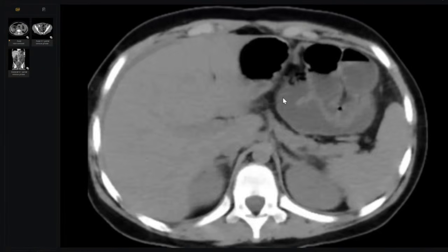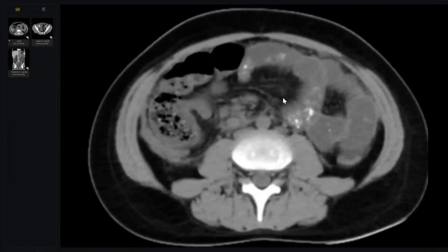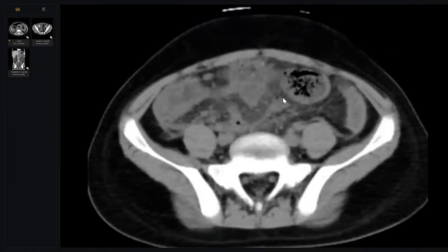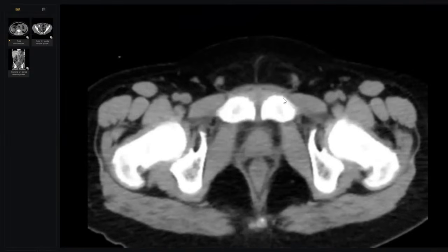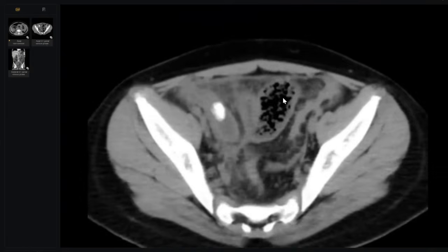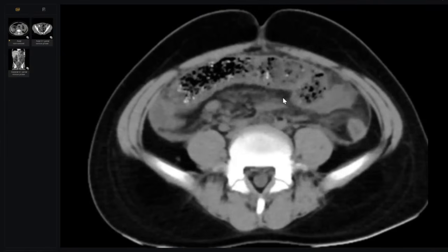Okay, I can see there is right-sided mild pleural effusion with underlying subsegmental collapse. This is a young patient, 14-year-old male, who has presented with pain and fever in the right iliac fossa. I can see that there is fat stranding in the right iliac fossa. Stop me at the slice of the pelvis for you. Please scroll up.